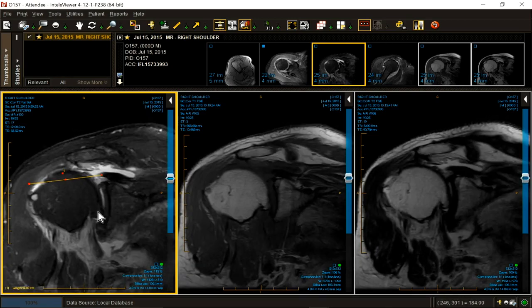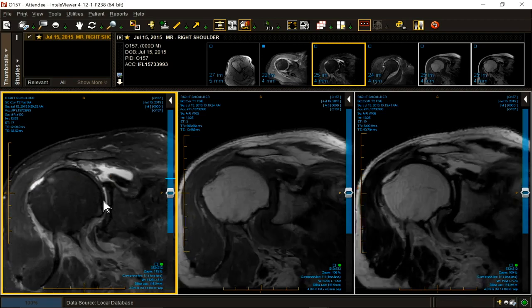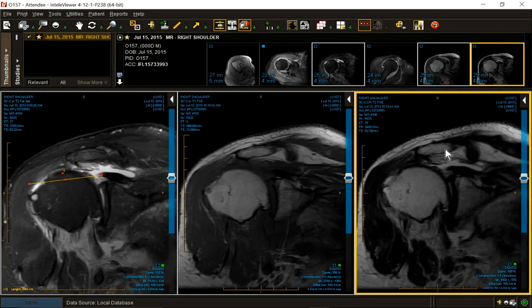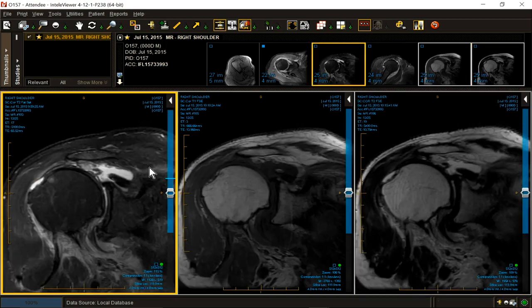Biceps, we already established that is ruptured. Decentering, absolutely. Arthritis, absolutely. AC joint separation or fracture? No. But she does have a large gap there because somebody went in and cut it out. She had a prior Mumford procedure. Okay. That's old news. What's new news?